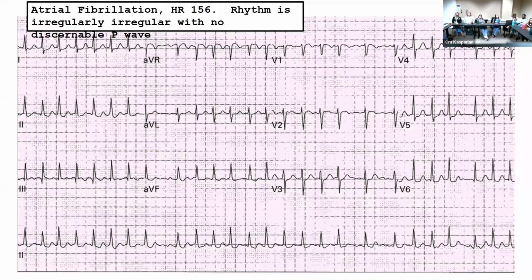So yeah, you can have moments when you get a sinus beat. If you look across all the leads in that one moment in time and it looks like a sinus beat, that doesn't mean that the rest of it's not AFib. It means you might have just gotten a sinus beat through. Because all of these, the sinus node is usually still going.